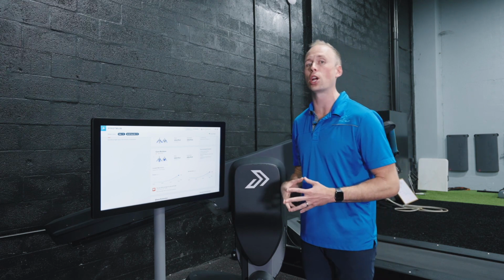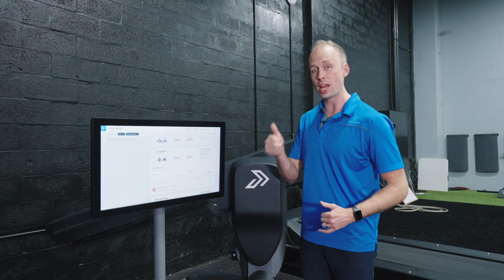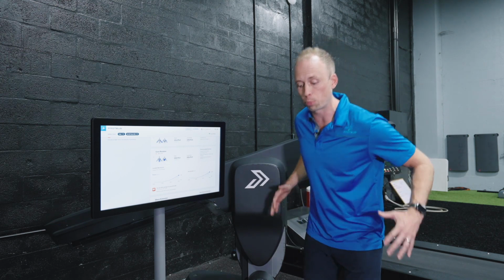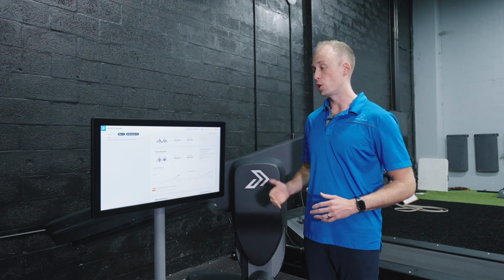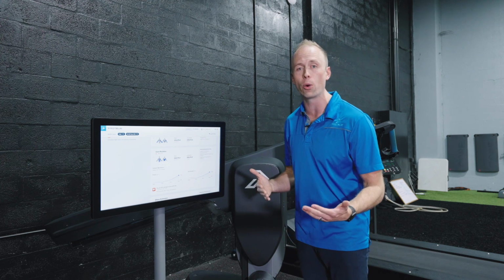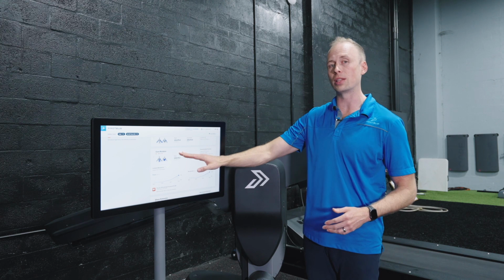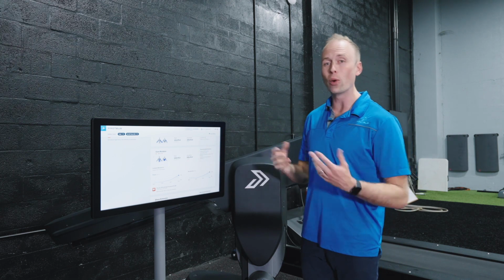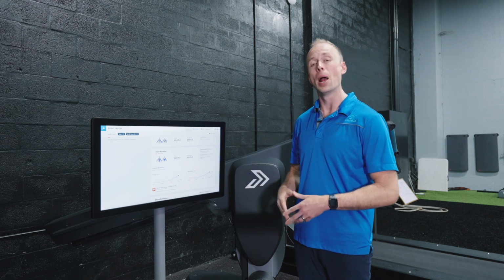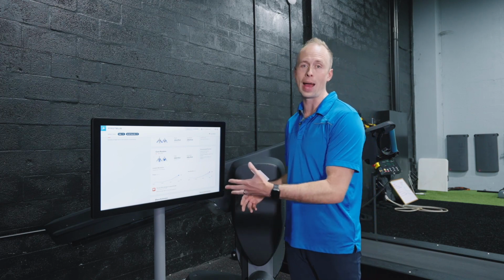If you were to do a vertical jump and you start with a static start, so you go into a squat, pause, then jump, and you compare that to a regular counter movement jump where you preload before jumping up, your counter movement jump should have about 10 to 15% more power. And if it doesn't, then we're going to flag that, just like we're seeing this flag here, as a low elasticity score. And we will then recommend plyometric exercises for you to perform to improve that power output.